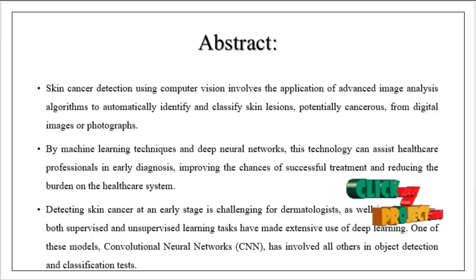So we basically have two kinds of images. One is the skin cancerous image and the other one is the normal image. If a skin cancerous image is given as an input, it should be segmented, then the features will be extracted from the cancerous portion and it will be classified as to which kind of disease it is, for example whether it is a benign type or malignant type. Finally, the performance of the process will be evaluated by means of accuracy.